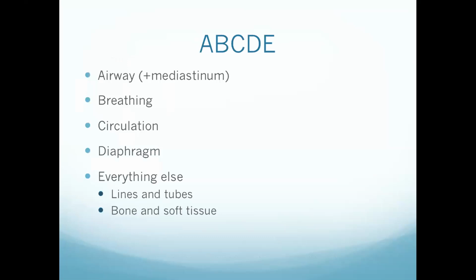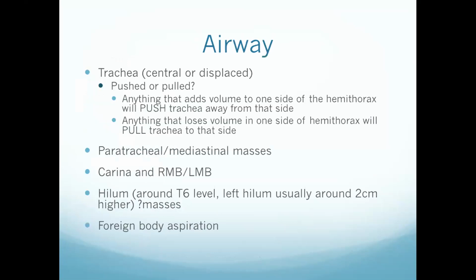So after you're happy with the quality of the film, you go on to the A, B, C, D, E of this. Starting with A, the main thing is the trachea. Is it central or is it displaced? And if it is displaced, is it pushed or is it pulled?